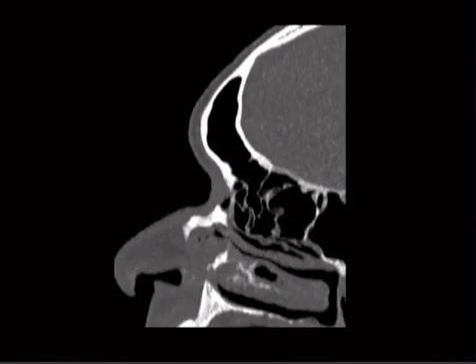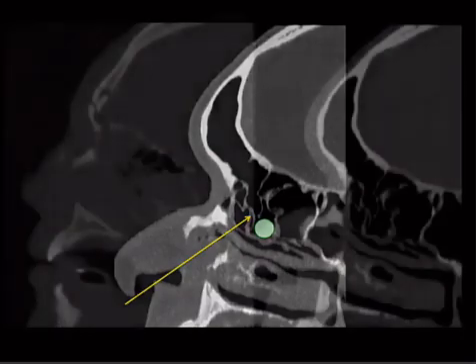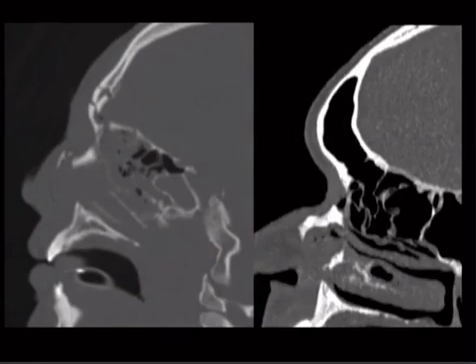Here's your frontal sinus draining into your ethmoid sinus, and it drains through a little passageway right there. Some people call that the frontal ethmoid recess. So if you can imagine that in this setting where somebody's had their face crushed and that thing disrupted, it's going to later on affect your ability to drain your frontal sinus.